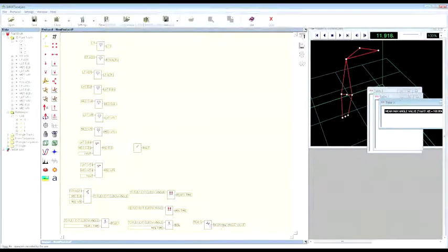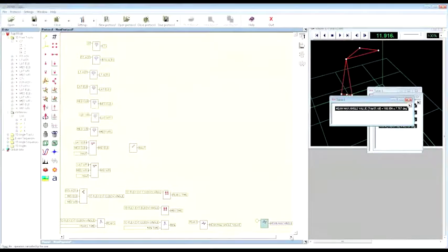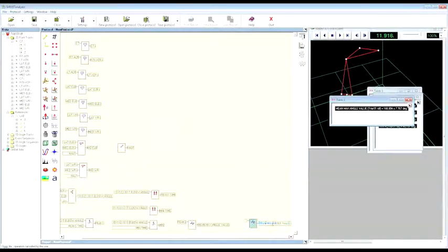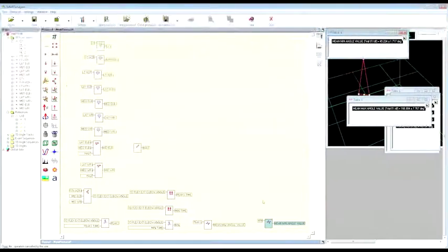I can do the same for the minimum. For the minimum, mean angle value, and in this case the input has to be the sequence of the minimum value of the angle. And as you can see here, this is the result. Now we can finish by computing the difference between the two values, which gives us an idea of the range of motion of the angle.